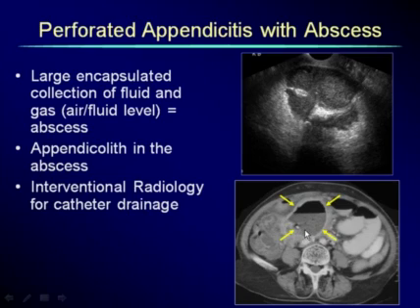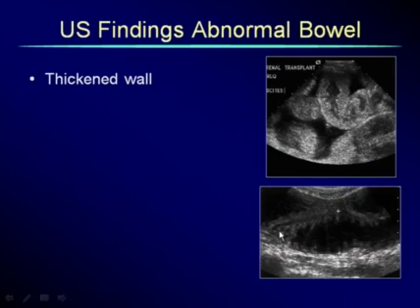So interventional radiology then, we guide them with ultrasound. They put their catheters in and drain this nicely.